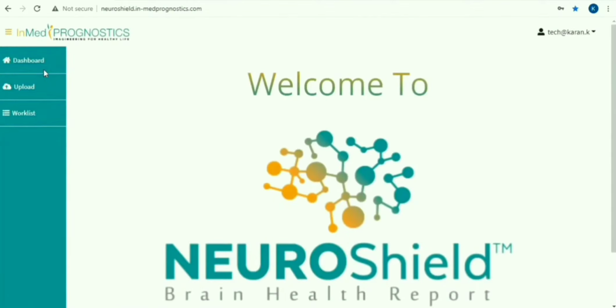Once logged in, three options will be visible on the top left side. Dashboard: this is the home page. Upload: by using this you can upload the cases. Work list: all the uploaded cases and their status can be viewed here.